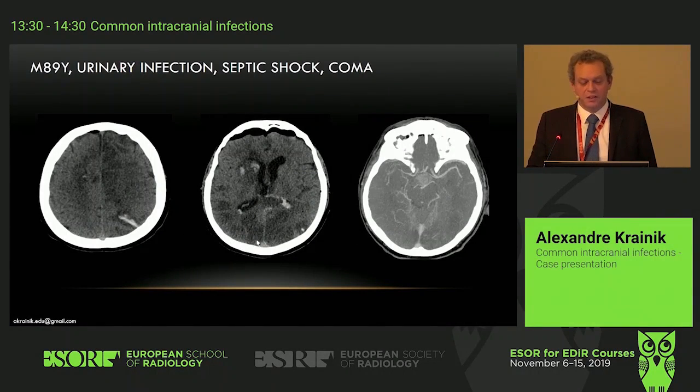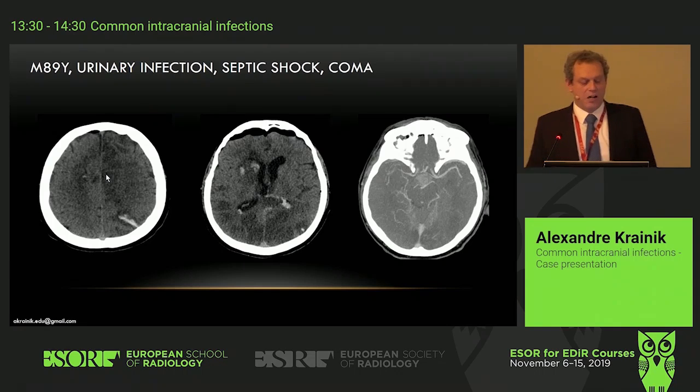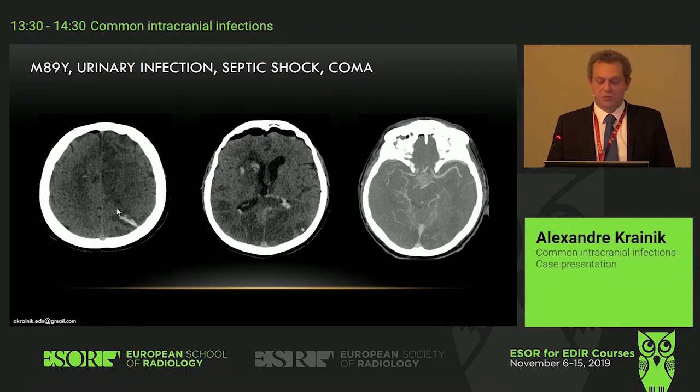You see, this is post-contrast, this is pre-contrast. You have many deep lesions. Then when you think deep, think of hematogenous spread, okay? And you have cortical, subcortical lesion. It can be due to stroke. Here you have bilateral occipital lesion that could look like stroke.